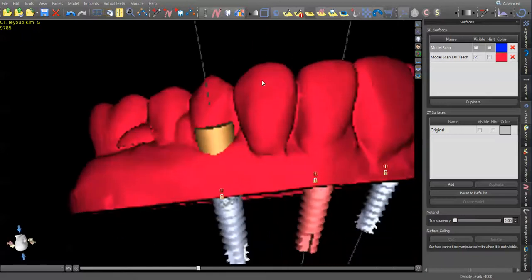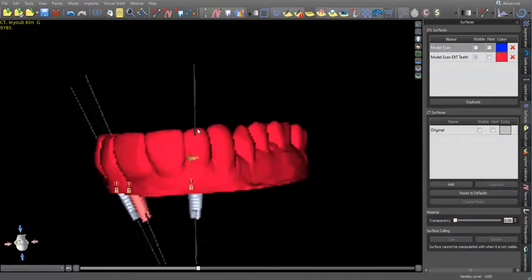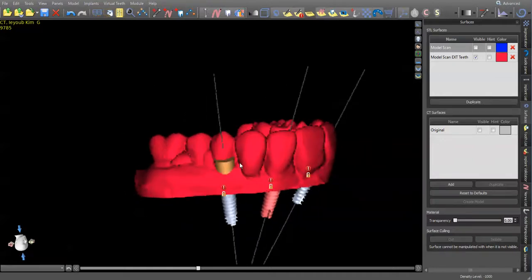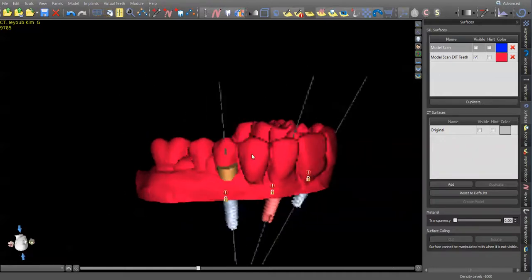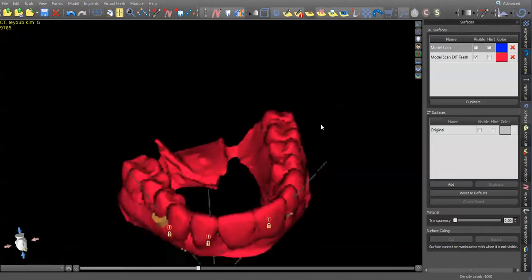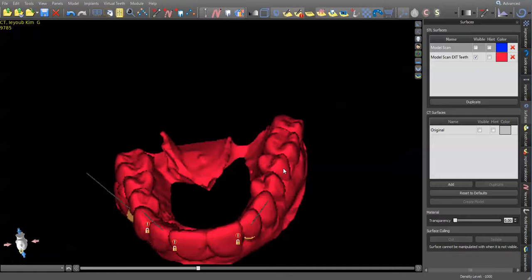And for the day of the surgery, what I'm going to do is extract tooth number 7, 8, 9, 10, 11, and 12. And then I'm going to be putting my guide down. So I'm going to build my guide to fit over this first molar across the arch, and have at least 2 teeth, so canine and premolar, all the way out to this premolar, just for a little bit more stabilization. You can even go to the first molar on the side as well.